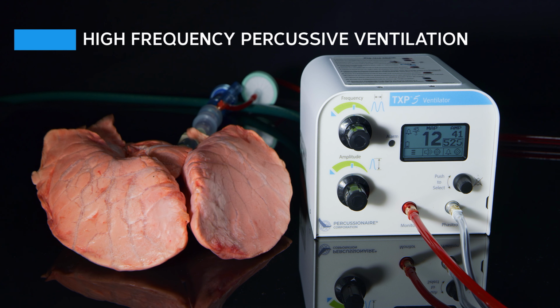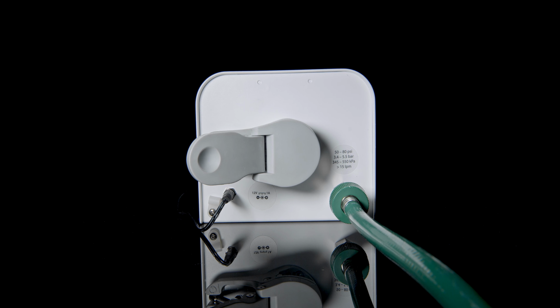High-frequency percussive ventilation. Device setup. To set up the TXP5, first go to the back of the ventilator and use the gray clip to attach to an IV pole. A green O2 hose is attached to the DISS connector on the back side. Power is connected to the ventilator with the inlet power receptor on the left.